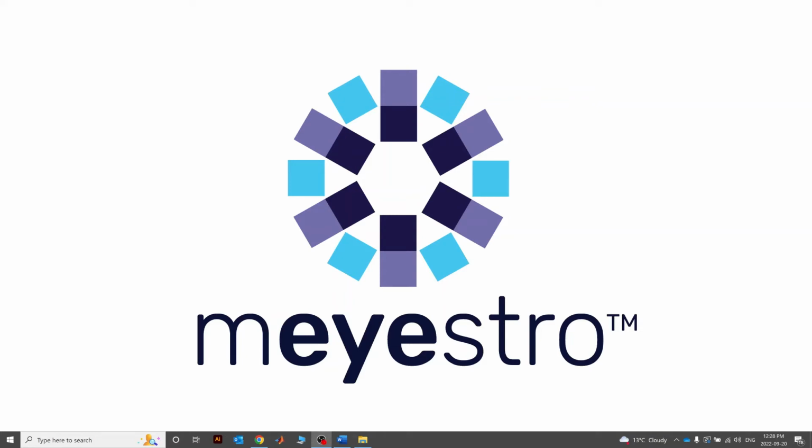Hi, and welcome to this mEYEstro Automated Outcome Software Analysis quick tutorial. Today, we will learn how to install mEYEstro and use the 3 trial data files that are provided in the mEYEstro download folder. This tutorial is not to show you all the features, nor to explain all the advanced parameters or customizations of mEYEstro, but rather to get you started very quickly with using mEYEstro with the provided trial datasets.